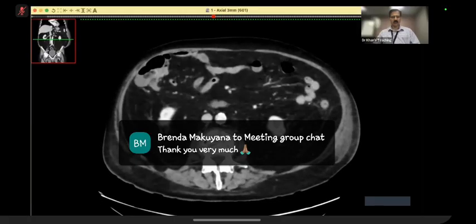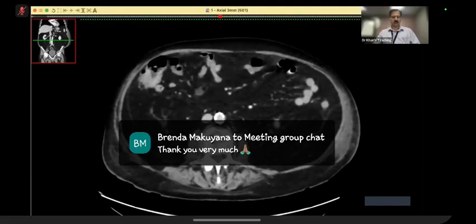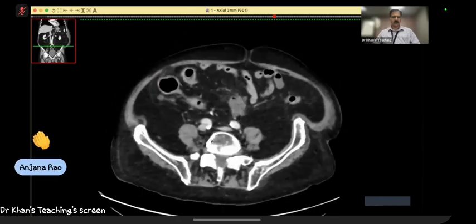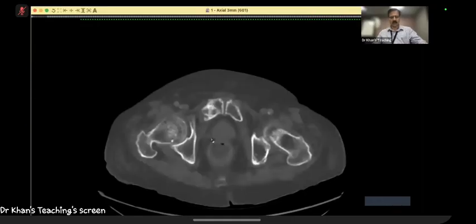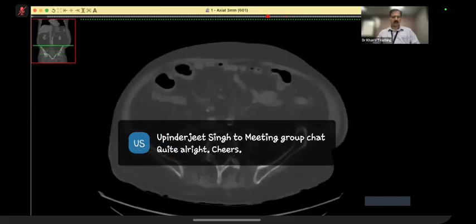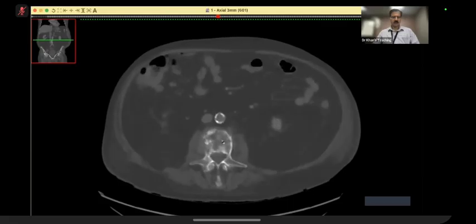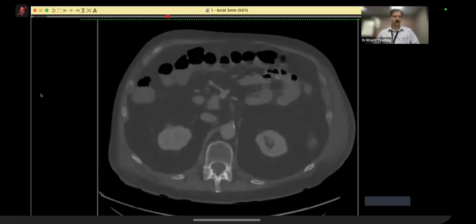And then you see this destruction. Actually, there was a fracture, which is a pathological fracture, secondary to the metastasis and secondary infection. Just to make a point, this was also an old fracture with metastasis. And here you are, this is the area where you can see fractures. I've shown you the soft tissue abscess.